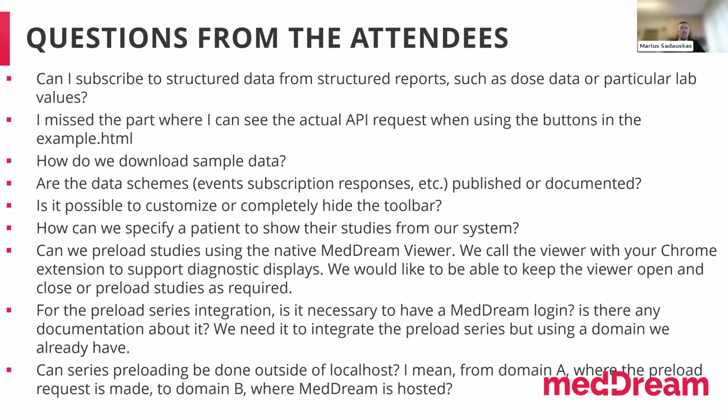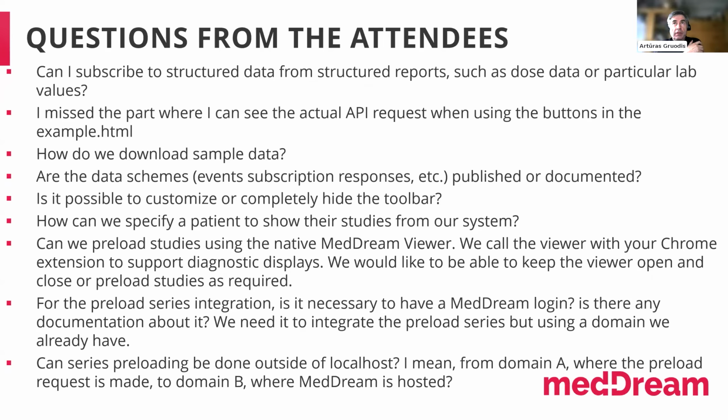Basically, in token disabled integration, you can pass patient ID, and then MedDream will show a dialog box with a list of patient studies, and the user will be able to select them. In token enabled integration, you can do the same. And you can also configure MedDream to open all patient studies automatically.